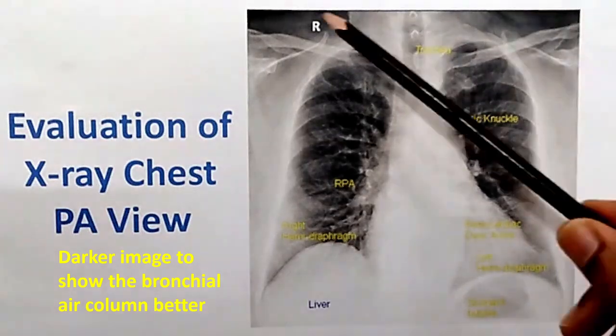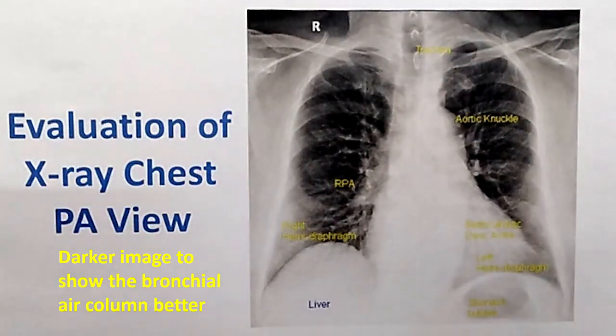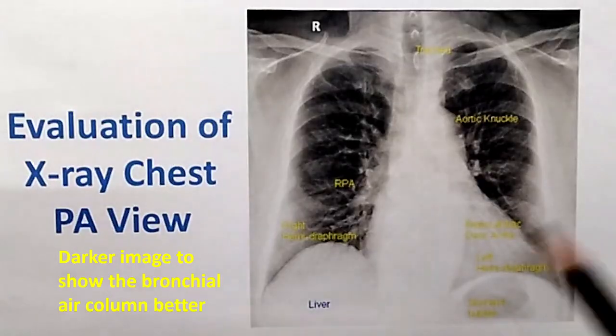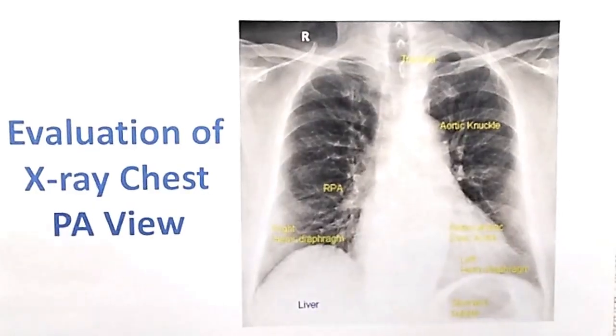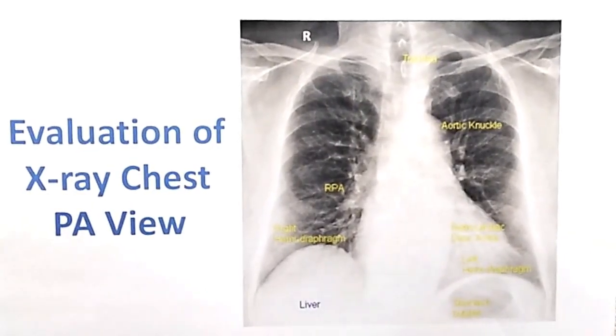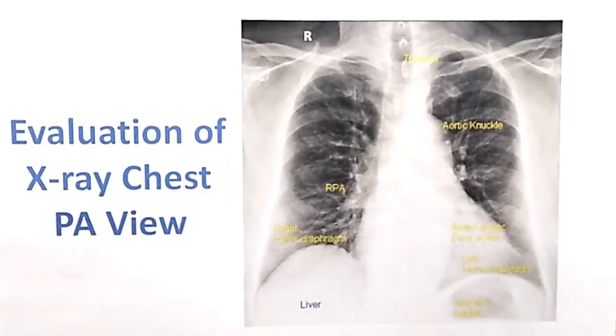Then cervical rib can be missed unless you look for it. In some cases, cervical rib can present with symptoms similar to cardiac pain because of the root pain. There are differentiating features, and you always look at the cardiophrenic angles and costophrenic angles. This is the cardiophrenic angle, this is the costophrenic angle. Small pleural effusion may be visible as just obliteration of the costophrenic angles.